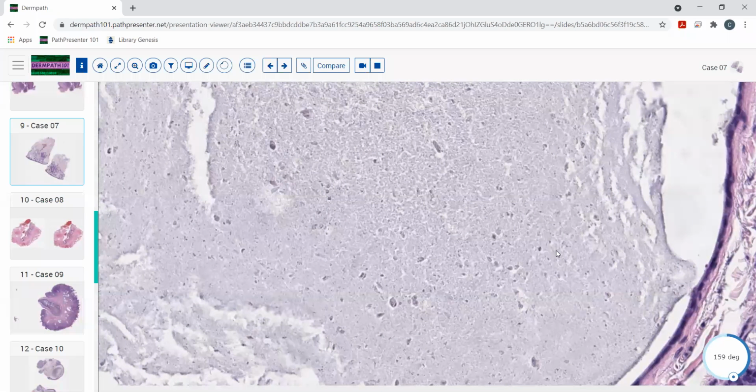Now we see apocrine hydrocystomas also, and we don't have an example of that today, but if you see one of those, it will have the apocrine differentiation in the wall of the cyst. You see the elongated cells with the apocrine differentiation, the snouting there, and the material inside the cyst of an apocrine hydrocystoma is usually a little bit more eosinophilic because it has more of a proteinaceous character to it.